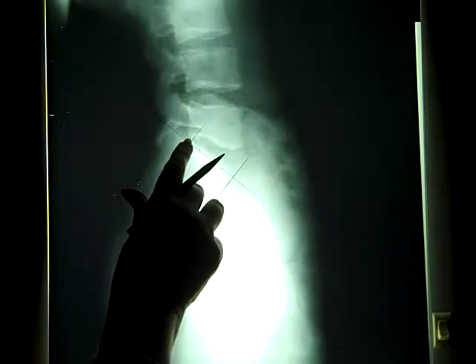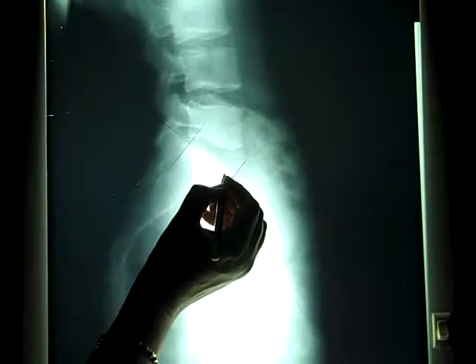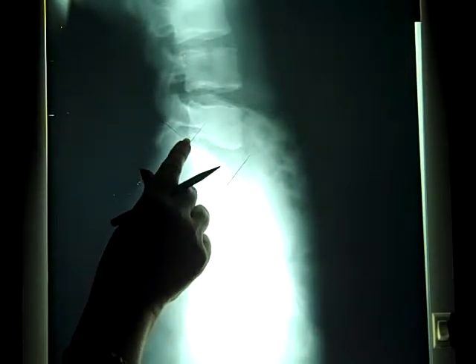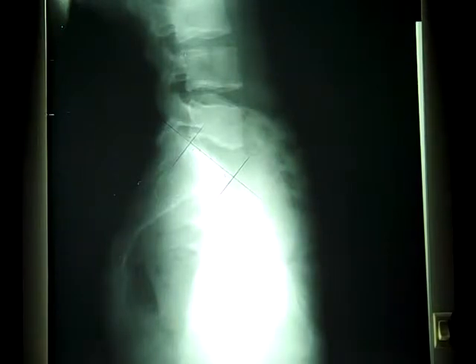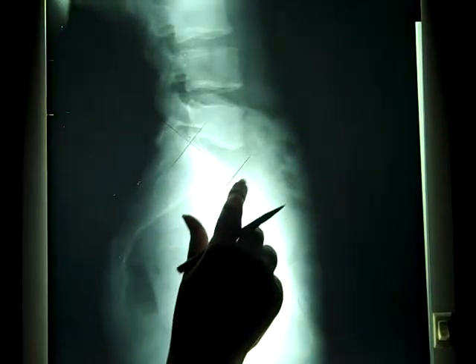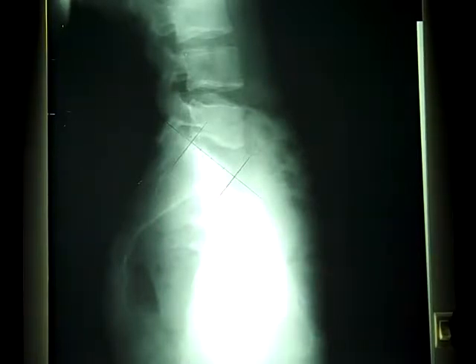But if this point had moved forward, this is grade 1, this is grade 2, this is grade 3, and this is grade 4. So we would watch to see where this point falls as the vertebral body moved anterior. If it is greater than a grade 4, if it's out in this area right here, it is called a spondyloptosis, or spondyloptosis is the proper pronunciation. I say loptosis because it helps me remember how to spell it. But spondyloptosis would be a greater than grade 4.